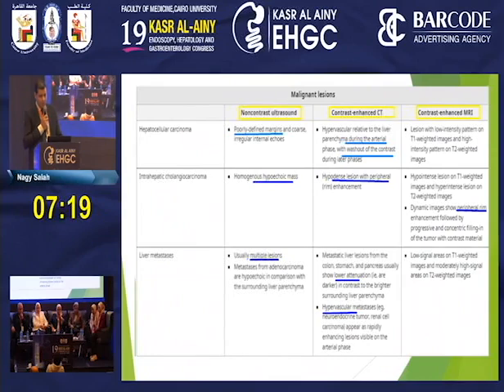Metastatic adenocarcinoma is hypoechoic in comparison to the surrounding liver parenchyma. Metastatic liver disease on CT, usually from the GIT, colon, stomach, pancreas, shows lower attenuation in contrast to the brighter liver parenchyma. Hypervascular metastases, mostly from neuroendocrine tumor, renal cell carcinoma, or thyroid, appear as rapidly enhancing lesions on arterial phase.